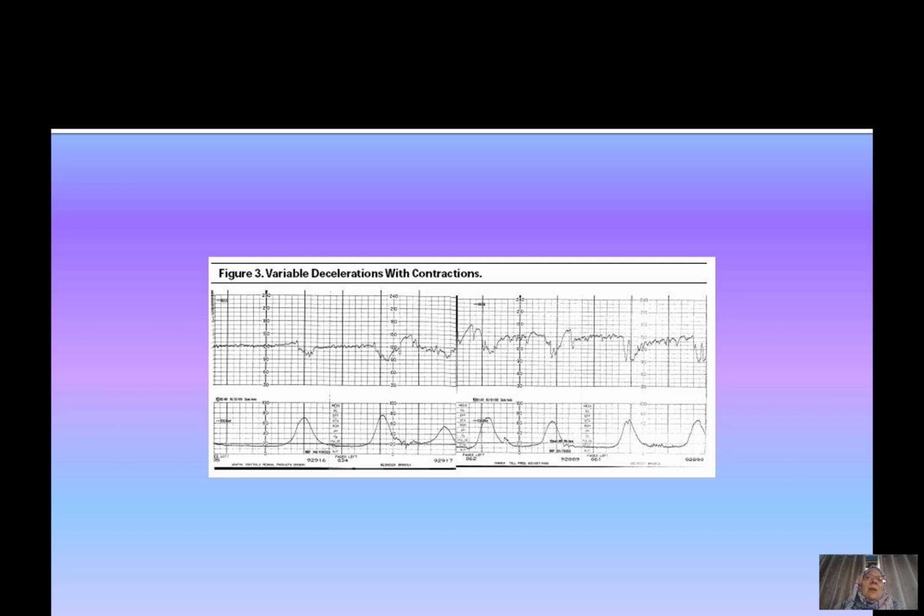So this patient, this baby, if the CTG recovers after that and continues normal, might continue with the labor normally. But if this continues with the decelerations, then it is worrying, and it might represent some fetal compromise that needs some more urgent action.